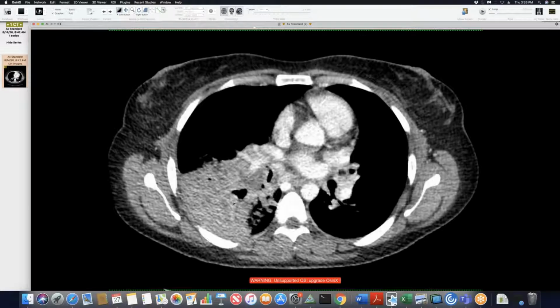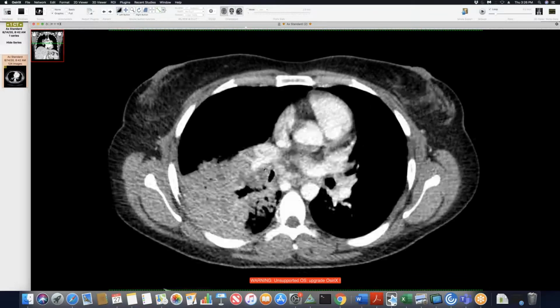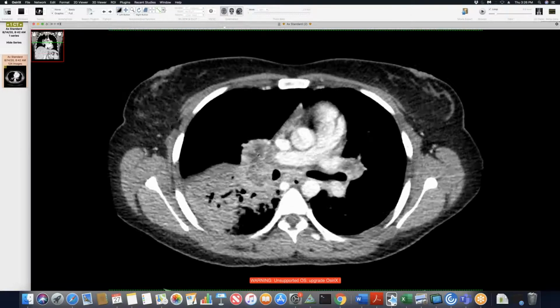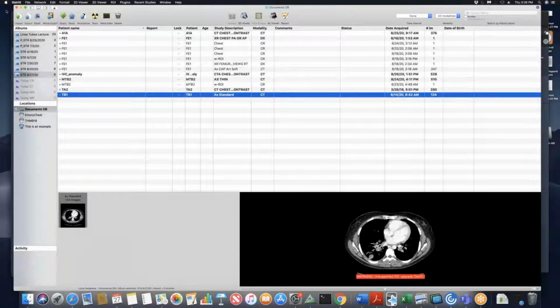This one is an AIDS patient, and you can see this necrotic lymphadenopathy, and you don't really see that in the case I showed earlier. That patient wasn't immunocompromised. But you can get that lymphadenopathy without immune compromise. It goes with primary TB. Right.